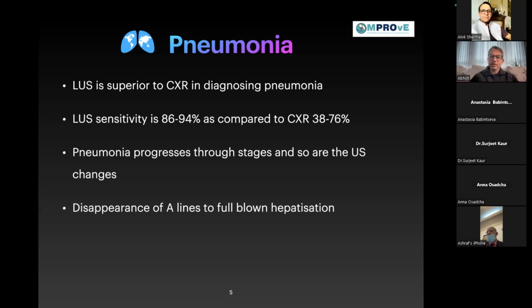And as for the pathology 101, hepatization is like the lung starts looking like a liver. It becomes quite solid. So if you don't have air inside the lung, then you can see the lung with your ultrasound probe. Now, in a normal lung, when it is filled with air, you only see the artifacts. When you have a full-blown hepatization, you reach that stage of the pneumonia, you actually see the lung tissue. And that is, understandably, called the tissue sign. Again, I'm going to show you.